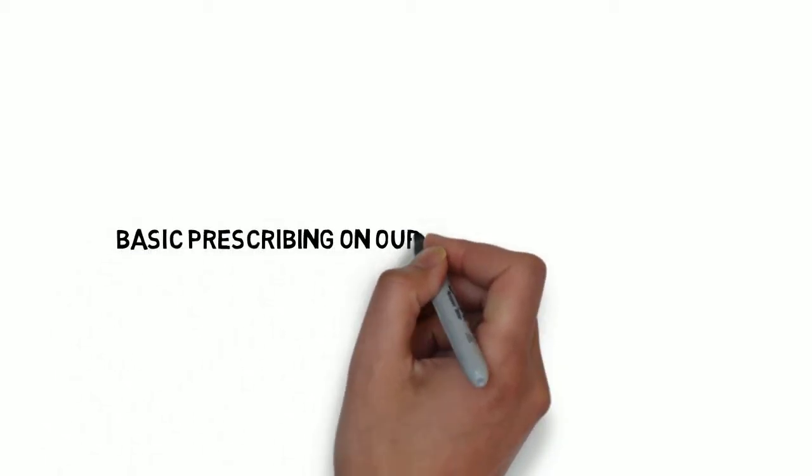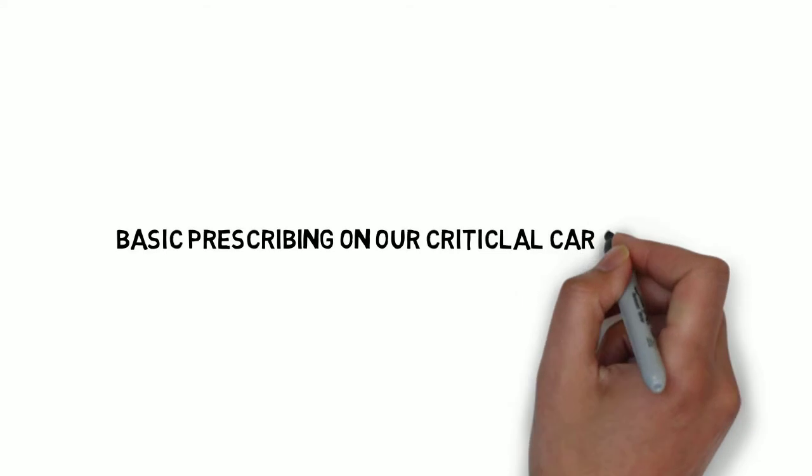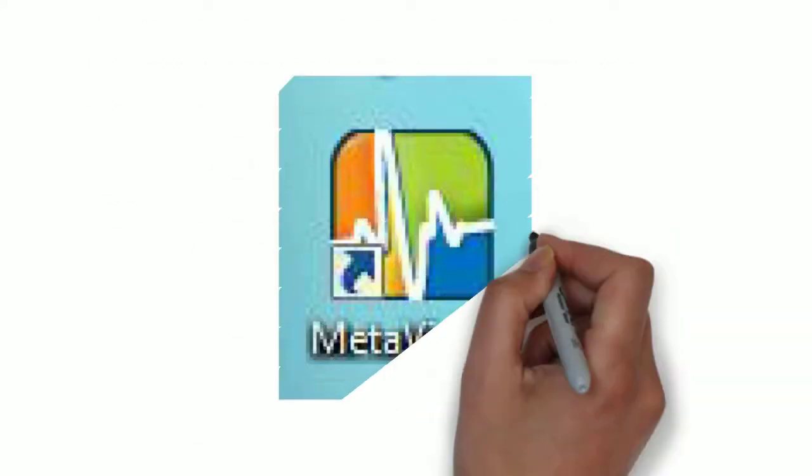This is an overview of the basic prescribing concepts in our critical care system using the CIS Metavision software. You'll find the icon on your desktop.